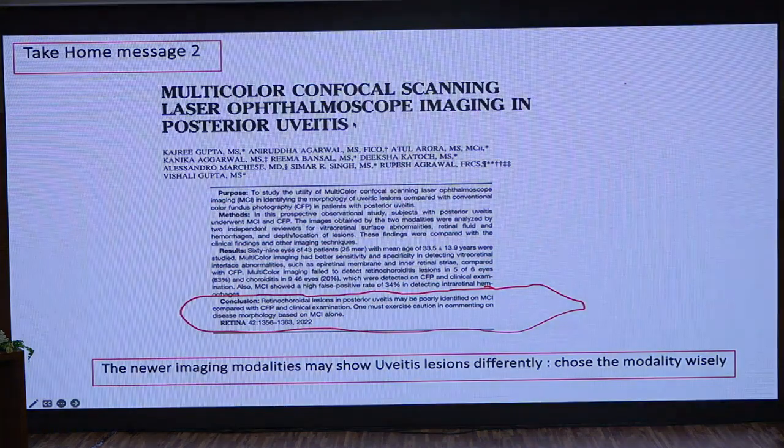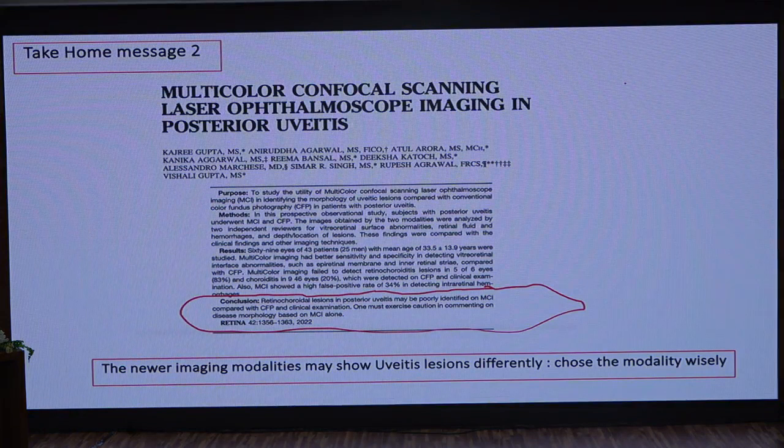We did publish this: retinochoroidal lesions in posterior uveitis may be very poorly identified on multicolor imaging compared with true color picture or clinical examination. So one must exercise caution in connecting to the disease morphology based on color picture or multicolor images alone.